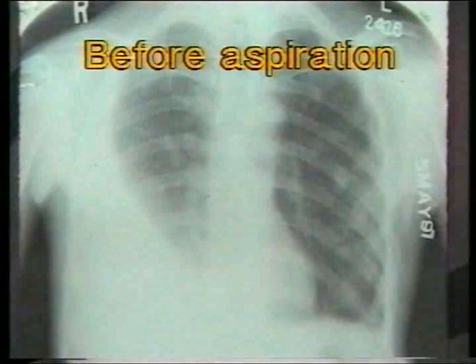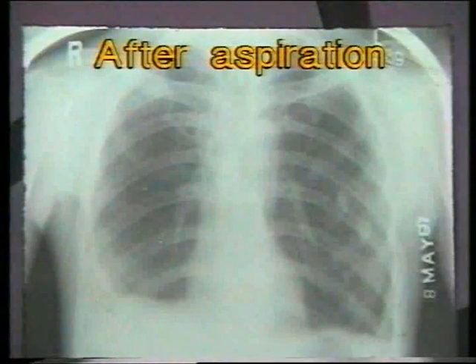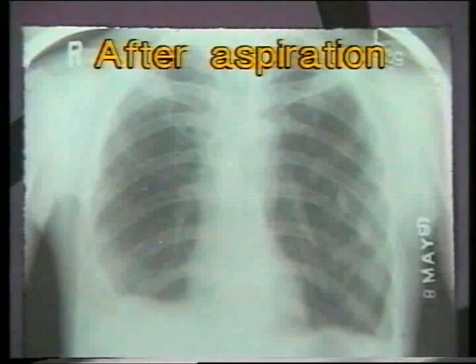Now this is a set of two X-rays of a patient of right pleural effusion before and after aspiration. This is a very typical shadow of pleural effusion, and this second X-ray after aspiration shows that the fluid is removed, the lung has expanded, the costophrenic angle is clear, and there is a diffuse thin haziness in the right lower zone, which is due to the pleural reaction or inflammation.